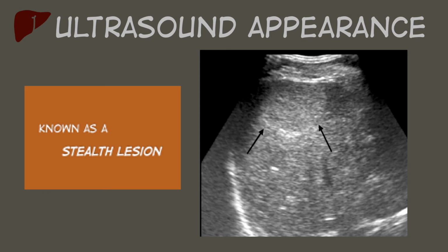Now, something to know about benign tumors is that benign tumors push normal tissue away. So what we're going to look for when we're looking through any organ is for normal tissue to take a different path than maybe what we would expect. So with this, maybe we'll see the hepatic vein get pushed off to the side a little bit. Maybe a portal vein dives a little different than what we would think it should. That might draw your attention to an area that very subtly looks like a focal nodular hyperplastic area.